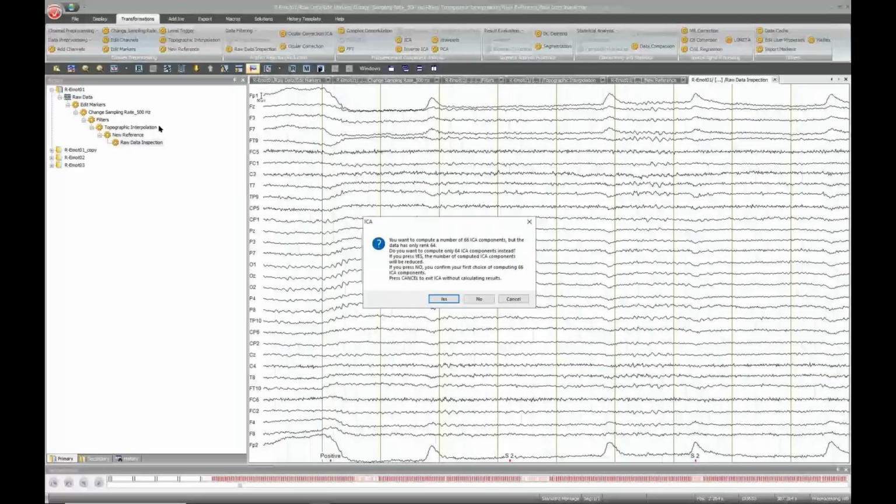And later on, we did the average reference, which, if you remember, is the average of all channels, then gets subtracted from each channel. So in a way that also increases the dependency between the channels. And because of that, we can calculate fewer components than the channels that we have available. And this is what this is warning us about. But this is not problematic.